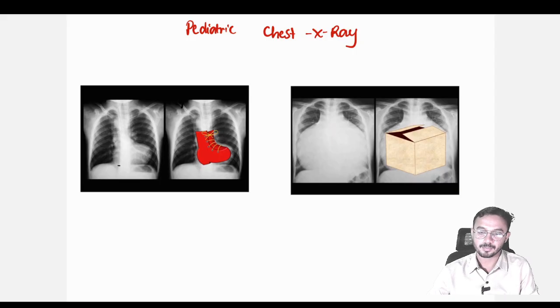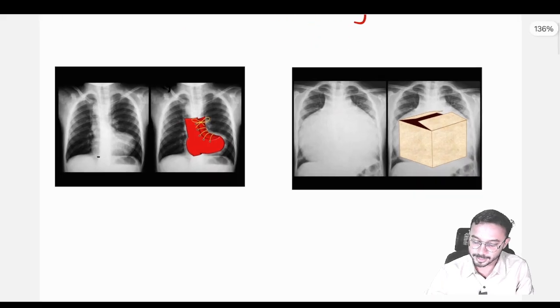In my earlier sessions, I have taught you all the disease aspects like coarctation of the aorta, tetralogy of Fallot, and Ebstein anomaly. I thought I'd be teaching chest X-rays separately, so let us look at these chest X-rays very carefully. Look at the chest X-ray over here.